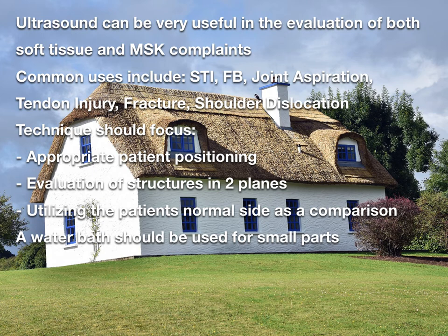For small parts, it often can be difficult to apply the probe directly to the painful area, and so if you're evaluating parts such as a tendon of the hand or a fracture in the hand, it may be useful to use a water bath. And lastly, I want you just to be aware of pitfalls. While ultrasound is very useful in the emergency department for both soft tissue and musculoskeletal complaints, it's not the end-all be-all, and there's definitely issues you can get into when you're not familiar with them.